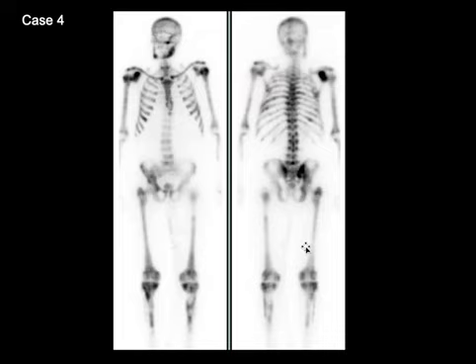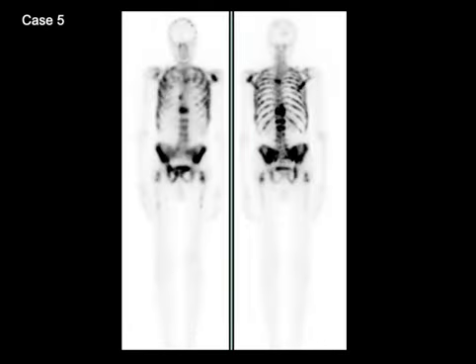Super scan pattern can be either due to disseminated bone metastases or due to hematological problems such as myelofibrosis or other endocrine problems such as hyperthyroidism or hyperparathyroidism. The way to distinguish between these two categories is that with osteoblastic bone metastases, the bone mets are seen wherever there is active marrow, and typically that uptake ends in the proximal humerus and the proximal femurs in the extremities. But with hematological problems or endocrine problems, there is bone marrow expansion, and the uptake is seen diffusely involving the distal extremities as well.